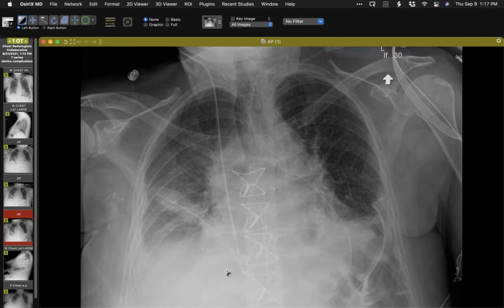So at that point in time, I did contact and speak to the surgeon who did the procedure, and he says he wasn't aware of anything unusual at the time of surgery. Now, typically, it's my understanding that when these are put in, they're put in by anesthesia colleagues at the time of surgery. But by all accounts, nothing unusual occurred. But after describing that and saying it looks like a catheter with a guide wire continuing inferiorly down the IVC, they did actually take this out uneventfully. And indeed, both a catheter and a guide wire came out.